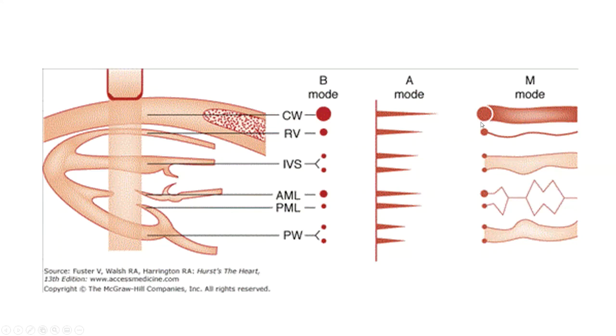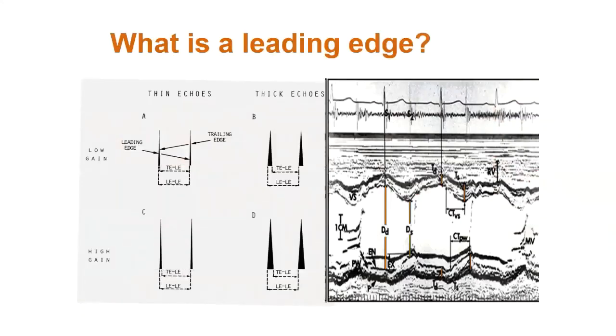The M-mode echocardiogram is showing you the motion of these structures throughout the cardiac cycle, and there is an associated electrocardiogram that's generally at the bottom of the screen. In fact, in earlier days, as is seen here, there was also a channel that was used for the phonocardiogram, which is one reason why cardiologists who trained in the 60s and 70s were very good at timing cardiac events, partly because they could associate these with the M-mode echocardiogram.